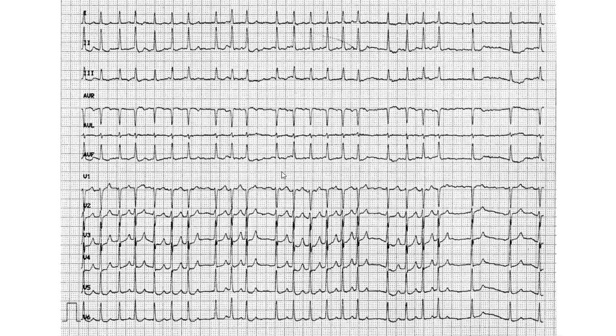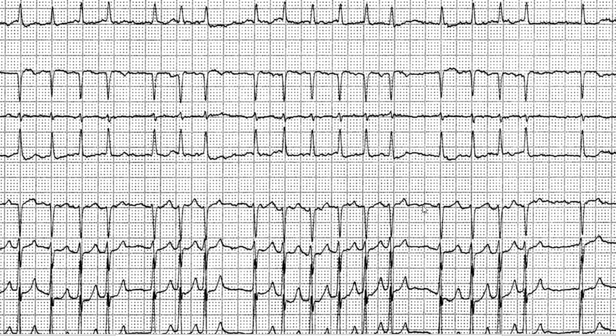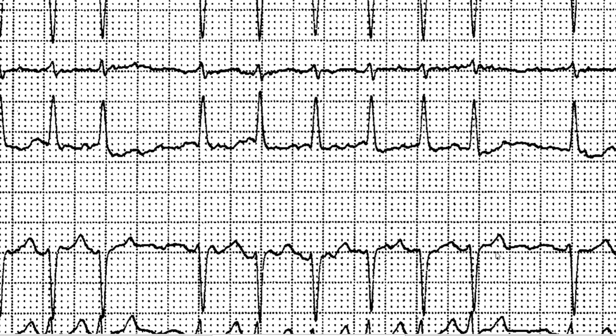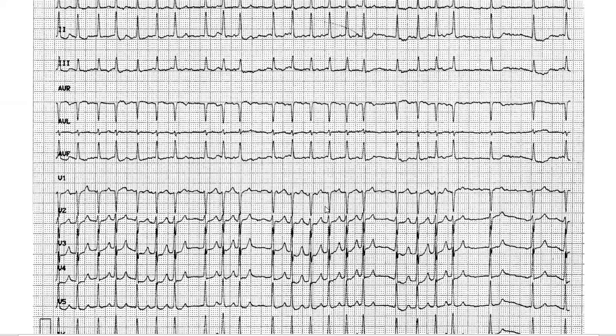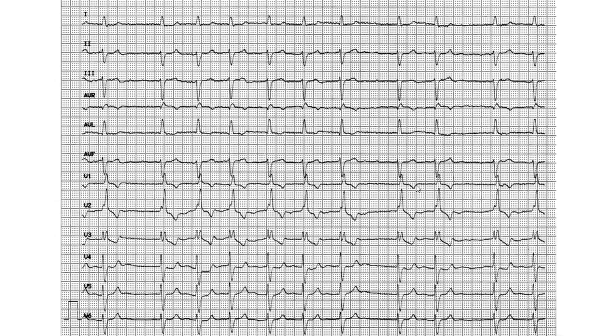Point 4 is what is the frequency of the fibrillation, and we can focus on some empty space that will help us out. Maybe this might be the best place for it, but it's pretty alright, possibly. 1, 2, 3, about 3, so we say about 500 is the rate, and that is fibrillation. So we're done with that example. Well, you have some more work to do, of course. Anyways, next, irregular. I'm sorry I didn't even give you time for this one.